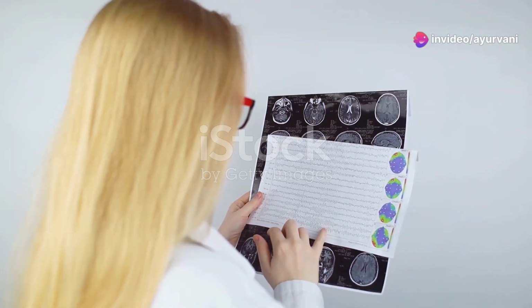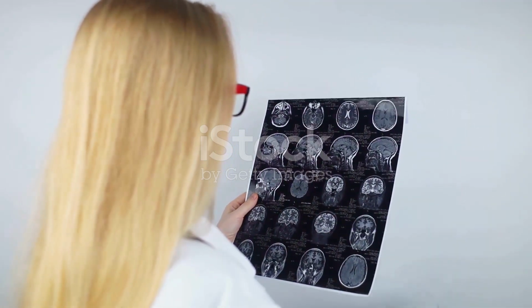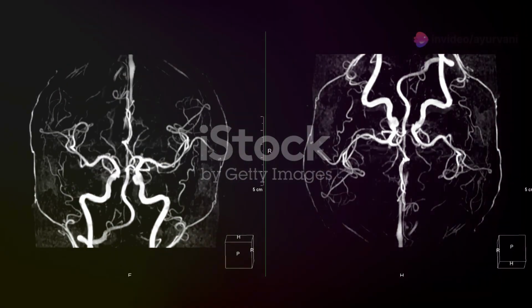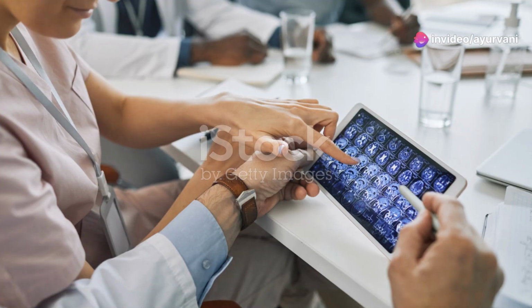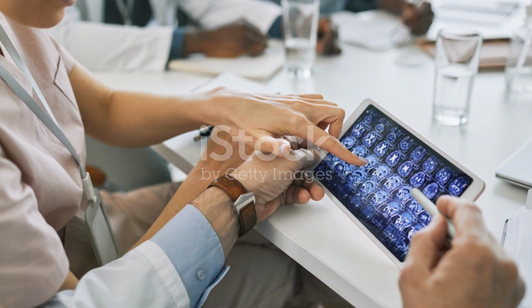So, to sum it up, look for hyperintense signals on T1 in acute phases. Use FLAIR to highlight subtle hemorrhages, rely on gradient echo for sensitivity to blood products, and monitor chronic changes with T1 and T2 hypointensities. And always be vigilant for complications like vasospasm with diffusion-weighted imaging.